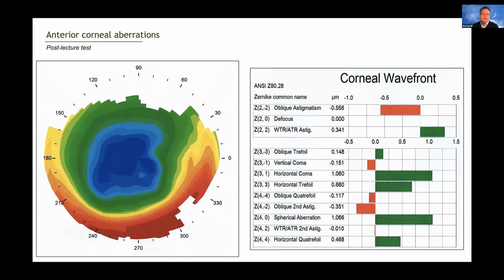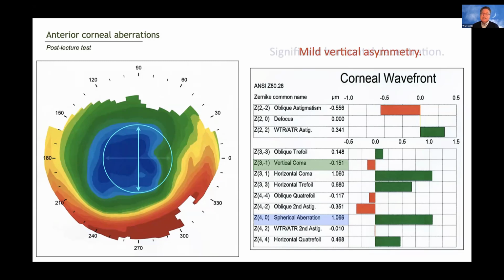We're going to start with somebody that's had myopic LASIK, and they're flatter in the center, and that ablation is slightly decentered. So we know that the spherical aberration is going to be positive, and it's going to be elevated. And because it's decentered, we're going to have various forms of coma. It's not decentered too much vertically, but it's decentered significantly horizontally.